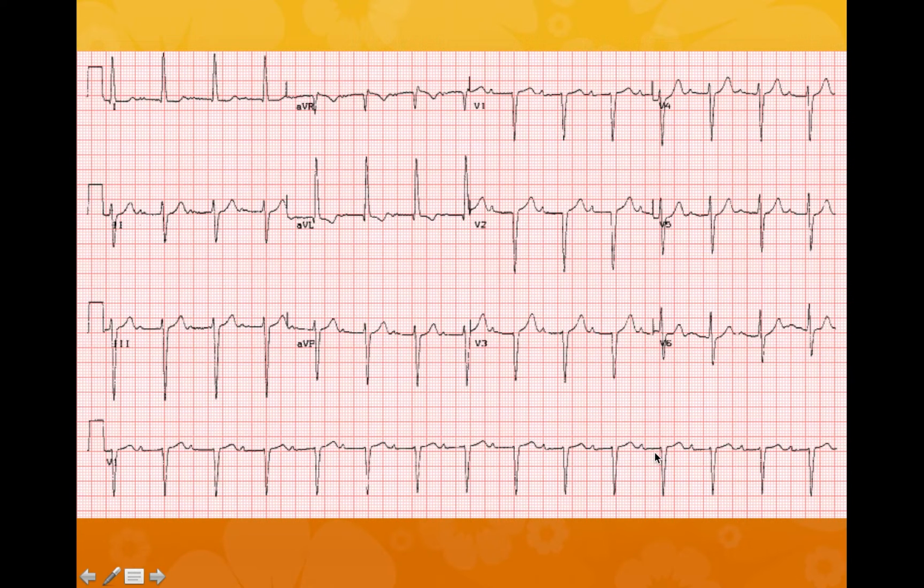First of all, let's look at the ECG that I put on the last video, the axis video, and let's go through the standard steps to work it out. Starting off with the rhythm, we have two small squares, three big squares, and we have the same there, so we can say that this is a regular rhythm. The rate is between 3 big squares and 4 big squares, so it's between 75 and 100 beats per minute. It's about halfway, so we can narrow it down and say it's between about 80 to 85 roughly.